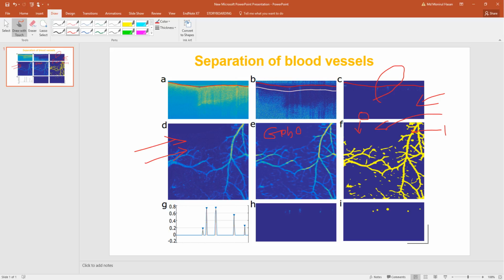So how can we set the threshold? What will be the implication of setting the threshold? If we set it high or if we set it low, then what will happen? I will explain in detail. Let's go to the coding part.